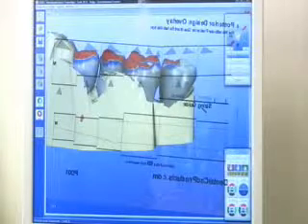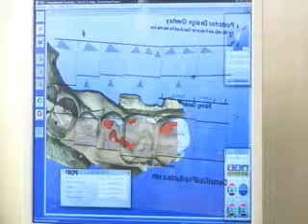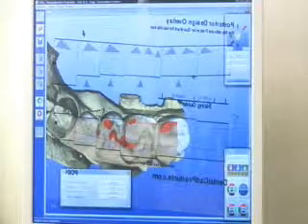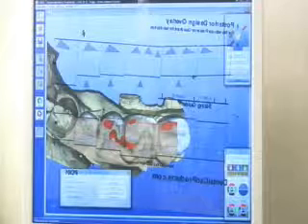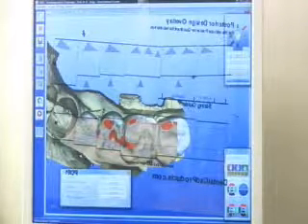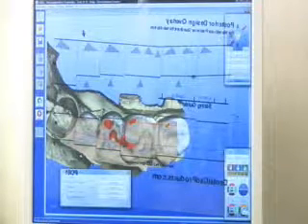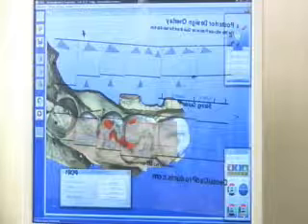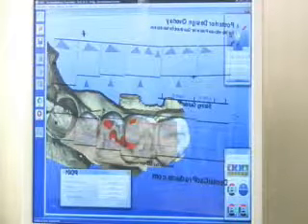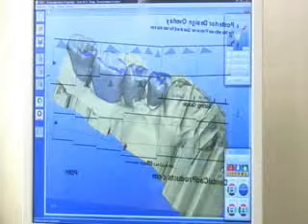Now that 21 has been placed, we can rotate it to the buccal. Now we can check the buccolingual width. We can also check the occlusion by putting on the antagonist. By double-clicking on the proposal we want to adjust, it will highlight, and then we can use the position tools, the rotate tools, Form Plus, Form Minus, to make whatever adjustments we want. And there again, we work down the line until the total proposal is the way that we want it.